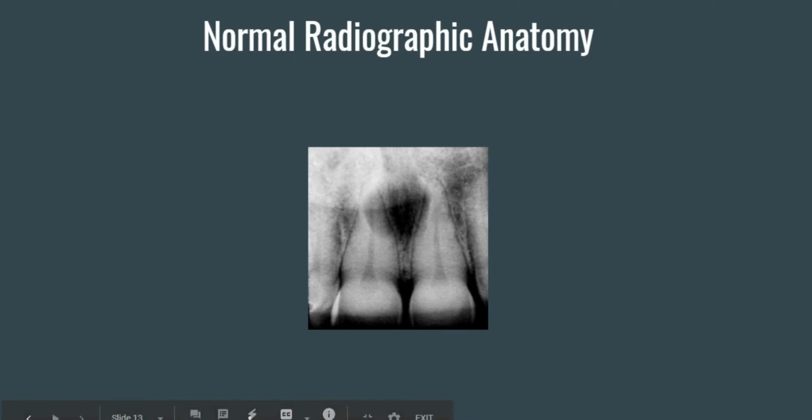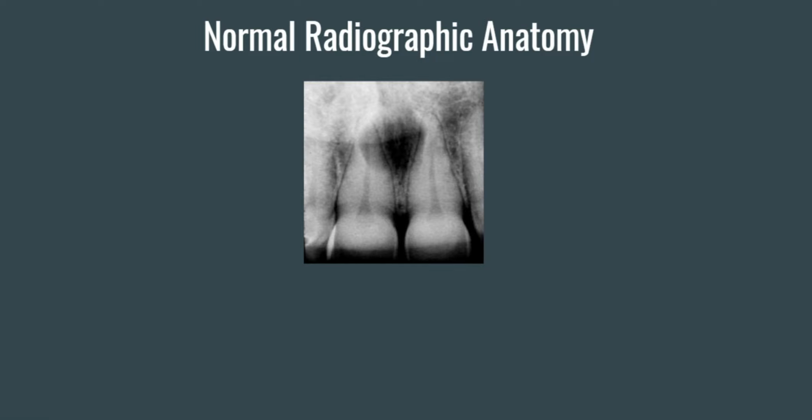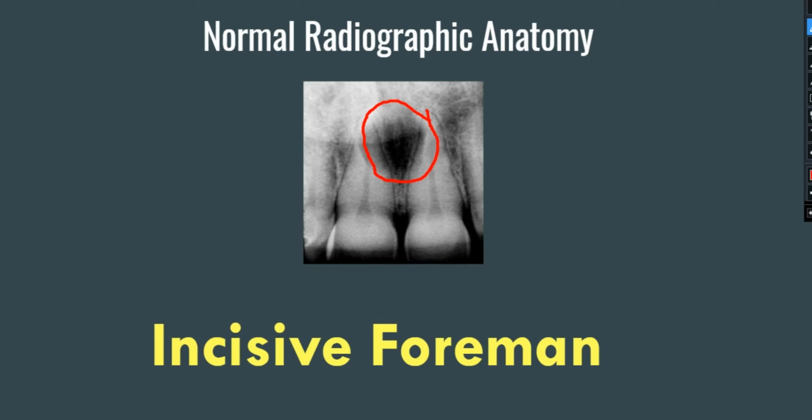Going to take it back and then fix that because that is off the screen. This is the review. So let's jump into a little bit of a review now. What is this an image of? If you were looking at this radiograph, what would you guess the anatomy is we're trying to depict here? And we are referring to this radiolucent area. And that is going to be the incisive foramen.